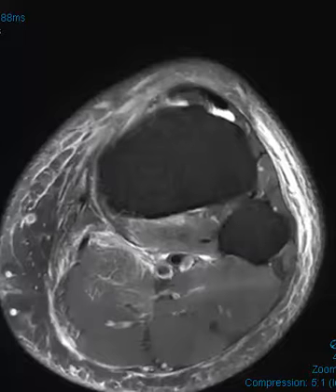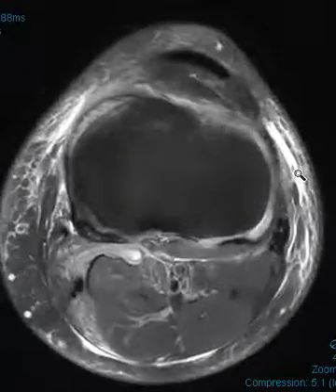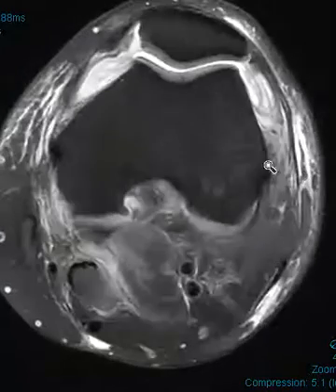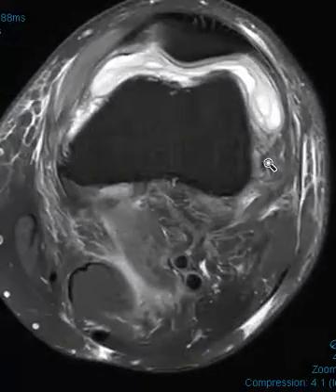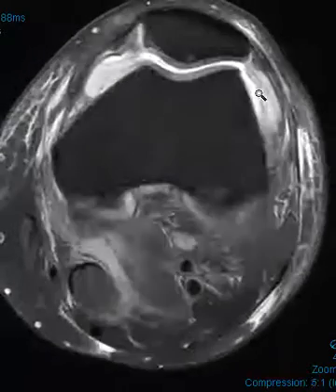Hello, it's Dr. Gay from First Look MRI, and this is a 41-year-old male presented with knee pain, nonspecific pain, no trauma. And on this MRI, we see that there is a moderate to large joint effusion with these funny streaks of low signal within, kind of bizarre looking.